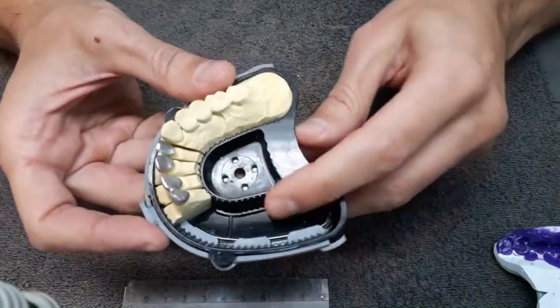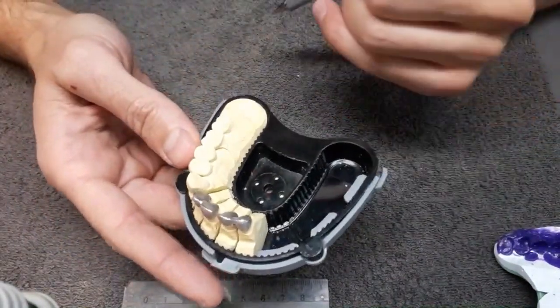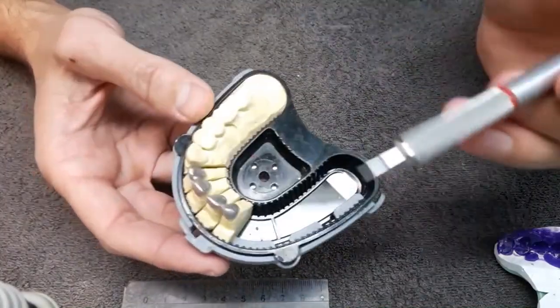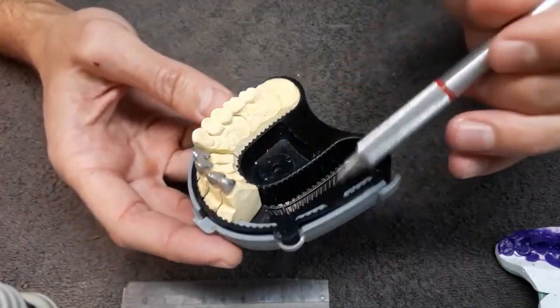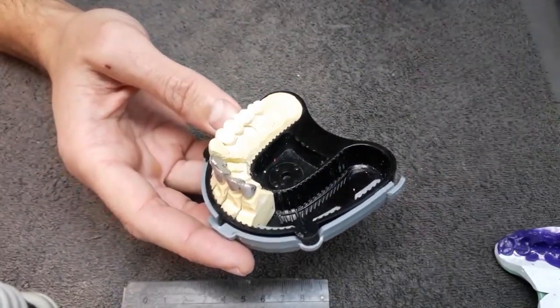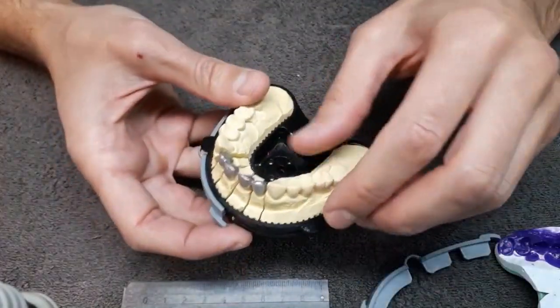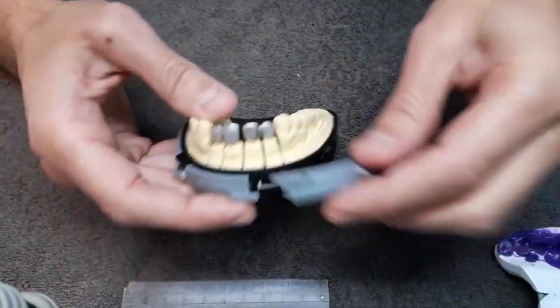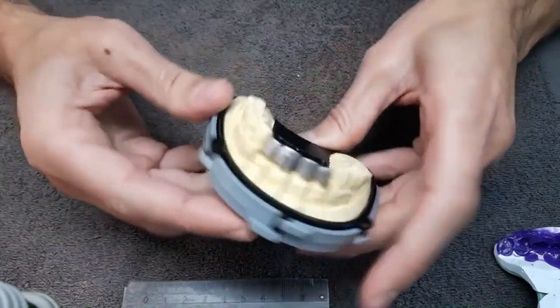And those winglets simply fix everything in place to make sure that the die has gone all the way down. So you see those retentions on both sides. So you have only one possible position of the segments in this plastic base.